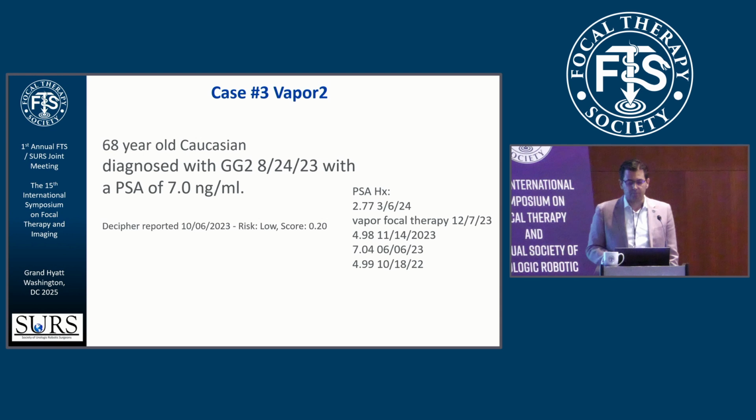Another case, this is from our Vapor 2, just to give you an idea what it looks like post-ablation. Today I'm trying to really just bring you guys full circle. Sangeet went over what things look like and how to score them. I'm showing you a few examples of different ablation modalities to give you an understanding of what that is.